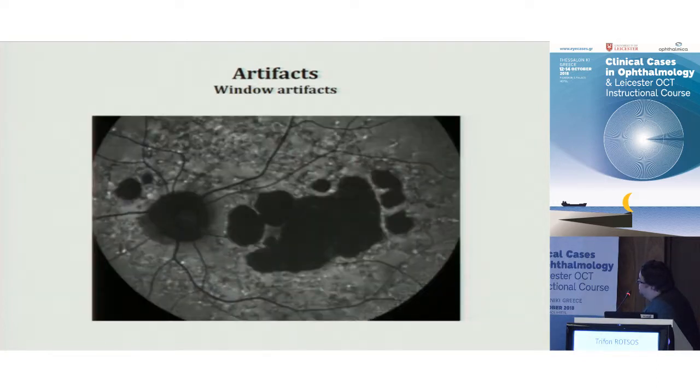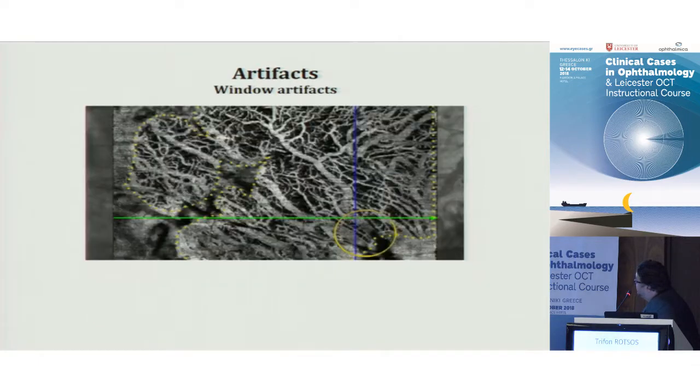This patient has Stargardt disease. It's obvious from the autofluorescence, but you can see when you do the OCTA in an area that has such an extent of an atrophic macula, you see the choroid vessels, they are white. Actually, in the OCTA, the choroid vessels should produce a dark image, like here, which is the normal area of the RPE.